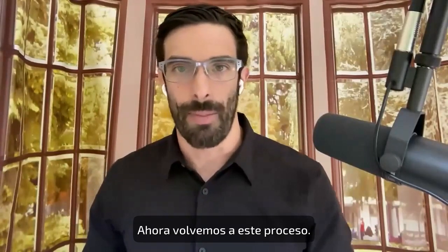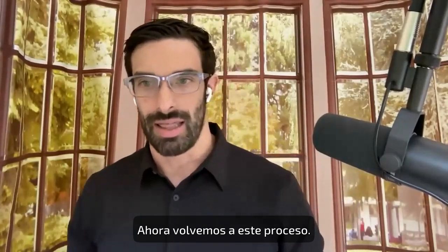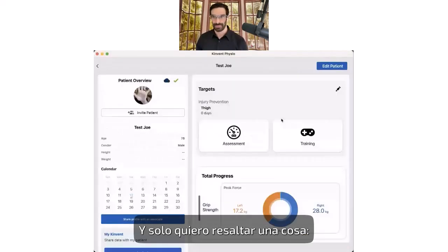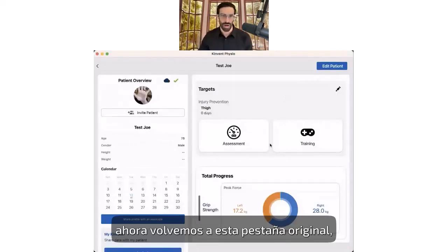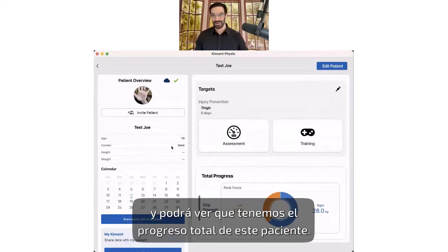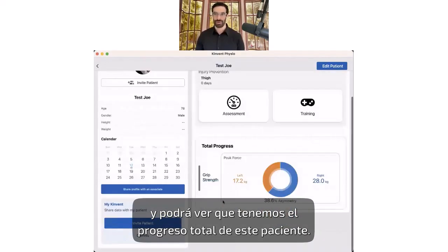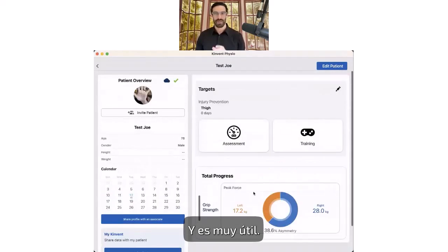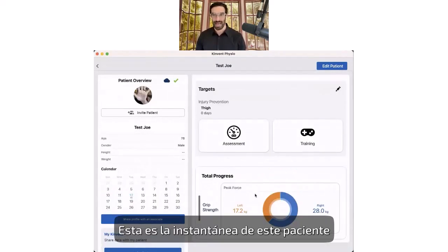So we are now back to this process. And I just want to highlight one thing: we now go all the way back to this original tab. And now you can see that we have the total progress of this patient that is loaded here. And that is very helpful. This is your snapshot of this patient.